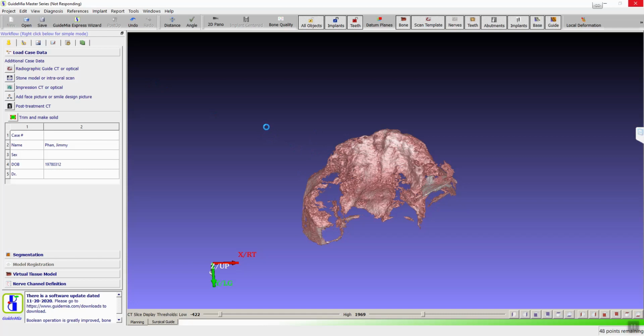Yeah, there is some radio-opaque element somebody added to the radiographic guide. Yeah, here. Poorly, I might add. So this data set is, let's say, 800 by 800 by 500. It's quite big. Well, it should be, we got a brand new fancy CT scanner. Oh, that's why. Pretty good quality, it looks like. Yeah, assuming the patient has any bones in their head.